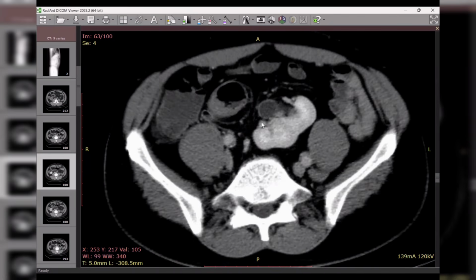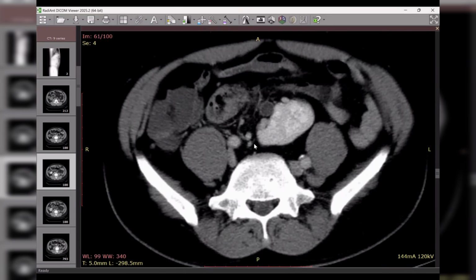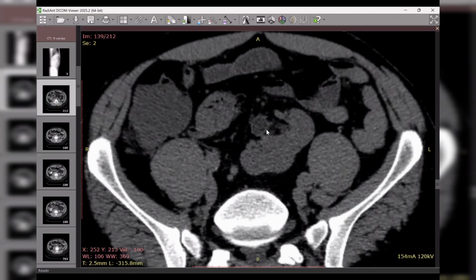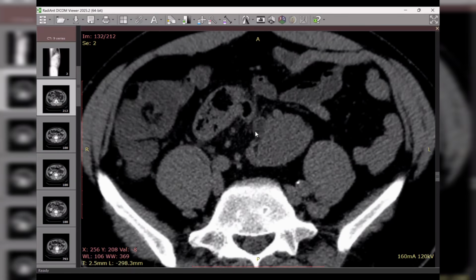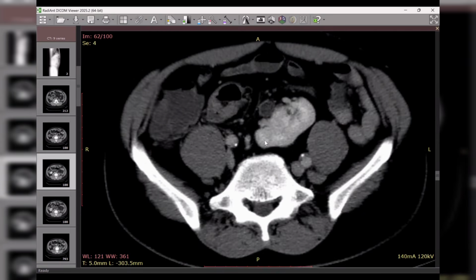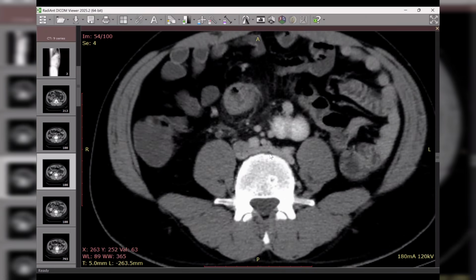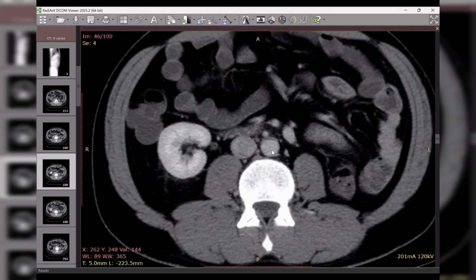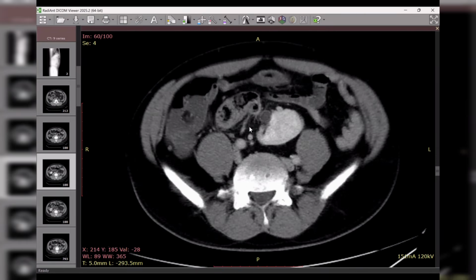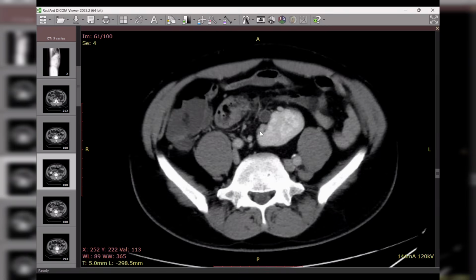it very well from the non-contrast. If we look at the non-contrast here, see that one. You told me there is a thickening. You picked it up very well from the non-contrast. So when we shift to the contrast scan, it is very easy for you to detect the abnormality. Actually, you did it very amazingly and very well. Thank you for this description. That was a case of complicated sigmoid diverticulitis with secondary pyelitis in the ectopic left kidney. Okay?